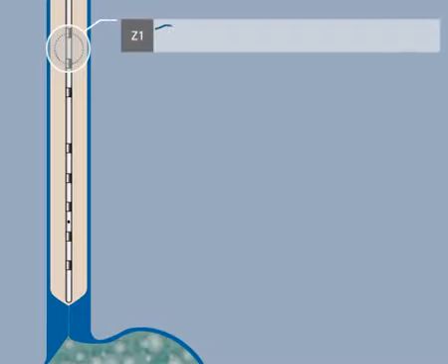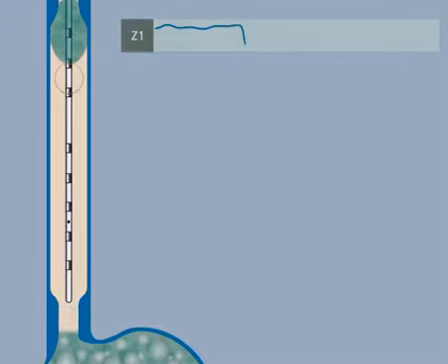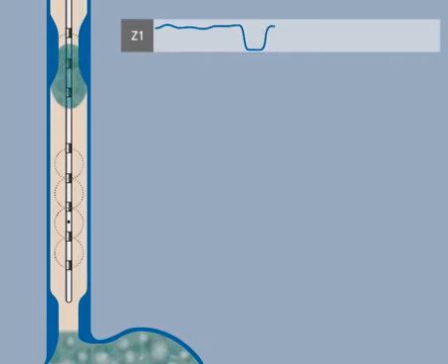Let's have a look at channel 1. What happens with the impedance when liquid is swallowed? This is the baseline level of the impedance signal, caused by the esophageal mucosa. When a liquid bolus touches both rings, the impedance drops. When there is no more liquid on channel 1, the value of the impedance signal will return to the baseline.